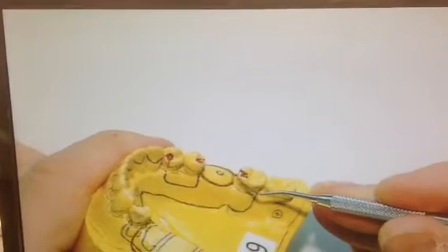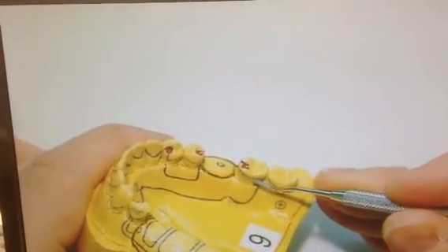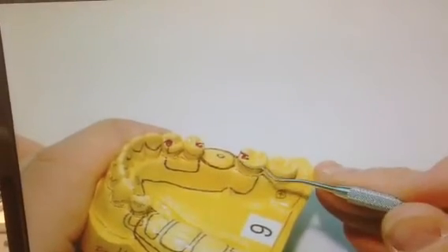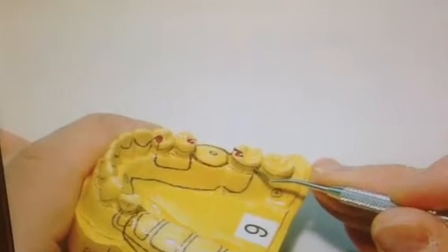When you do a plate on a tooth, any place that you do the plate, it needs to be at or above the height of contour and not interfere with the opposing bite. So you don't want it so high up that it's on these cusp tips, but you have to be at the height of contour.